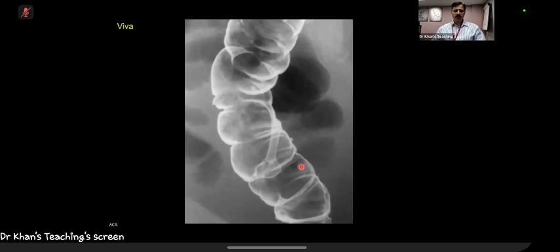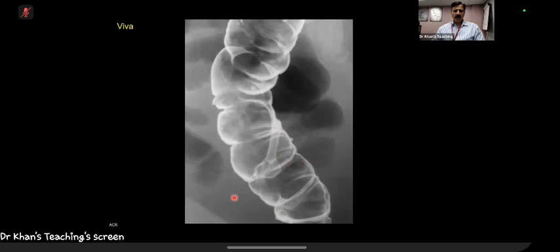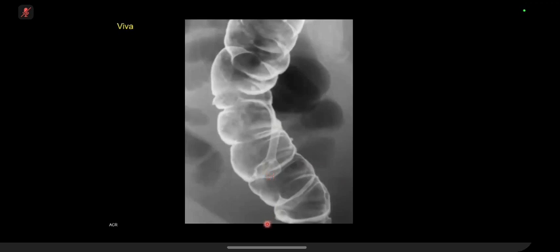Okay, so what kind of examination has been performed? The barium contrast study. So that's the contrast study. Okay. Enema. What do you know about the malignant potential of this? Is it more risk of malignancy or less risk of malignancy? These kind of polyps are benign. However, the sessile one is malignant. Okay, good.